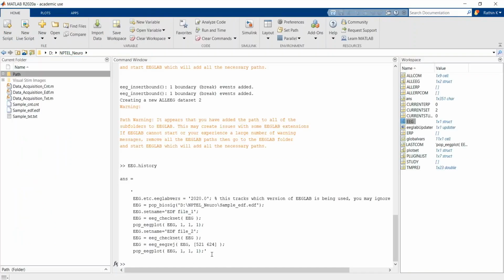So yeah, these are some of the basics of EEGLAB. I hope all of you have understood this. Similarly, for different acquisition systems, we have different formats of the final acquired data set, and how we can obtain it using different scripting options we will see in upcoming videos.